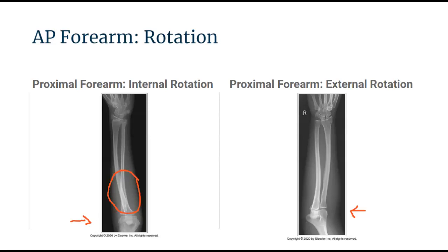In the next projection, looking at the condyles, they are again in an oblique projection. They're not in that true AP projection. We can't see the olecranon fossa as adequately. Also, looking at the degree of separation of these two radius and ulna, you can see that they're almost free of superimposition, and typically the radial head and neck and tuberosity are still superimposed in a true AP projection.